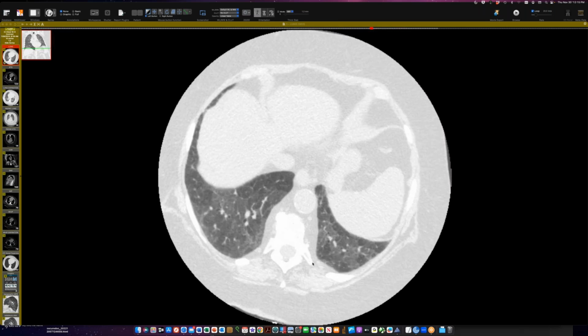And it's possible. I've seen bronchiectasis with it. I've seen large airways disease, but I don't recall seeing isolated air trapping. Is there any possibility the patient has both? Yeah, it's possible that there's both.